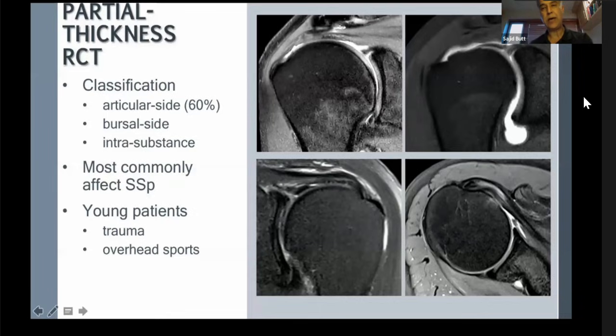This is a patient who has had an MR arthrogram, so we can see that there is fluid contrast medium in the joint. That's the supraspinatus, and again, irregular articular surface tear is seen. A patient of axial imaging of the shoulder, right shoulder. This is the subscapularis attaching to the lesser tuberosity, and here we can see increased signal intensity, which has split the tendon into a superficial and a deep lamella.